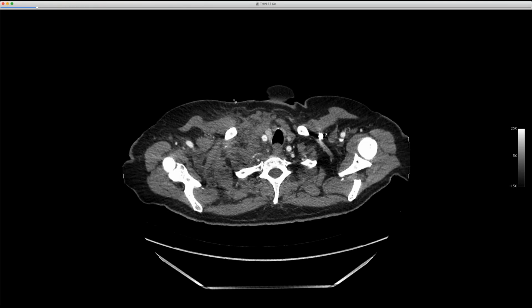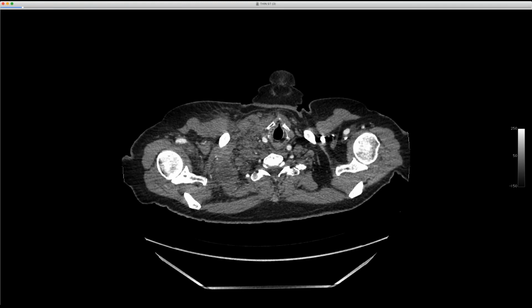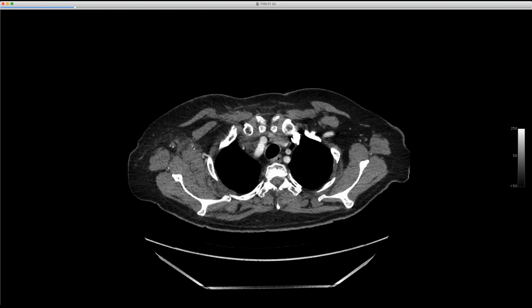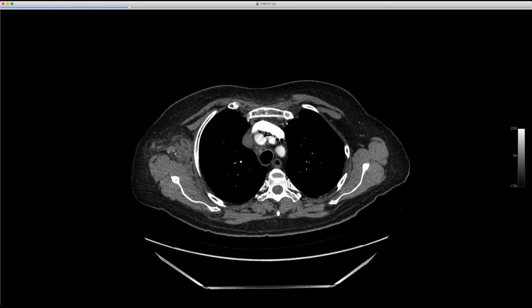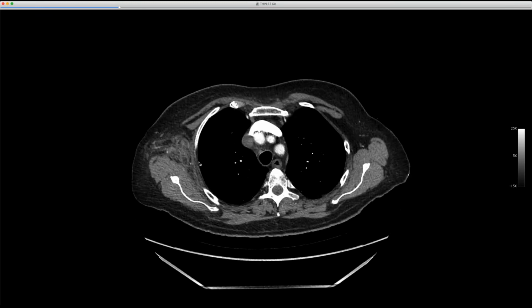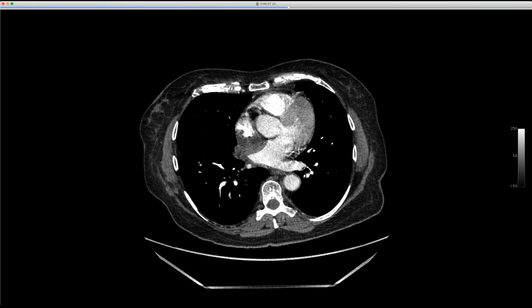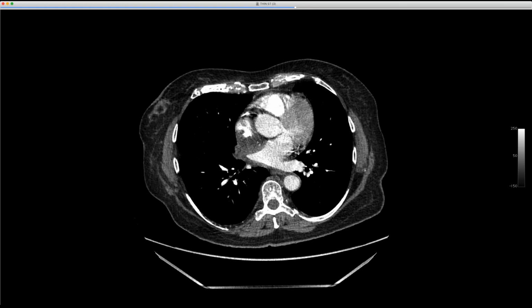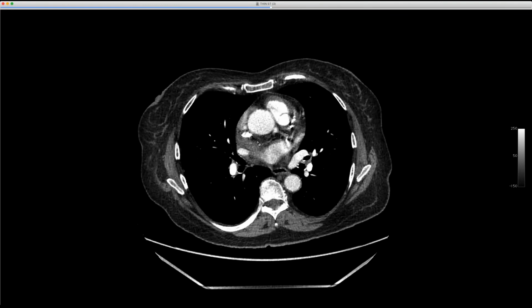And we did this CT, and you guys do see it, correct? Yep. There's infiltrating soft tissue in the lower neck, supraclavicular fossa, and you'll see the same thing in the right axilla. This patient was in her 70s. You see some lymph nodes hiding in here, but lots of stranding. The lungs themselves were fine, but there was this interatrial septal mass, and you could see the indentation on the left atrium. I didn't like that for just lipoma or fat, as it looked like too much soft tissue. But I was trying to tie this all together.